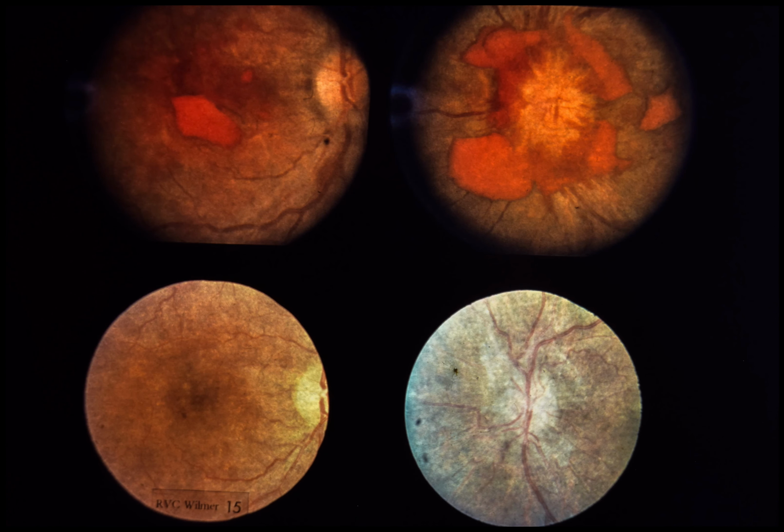Slide 15. Papilledema and subarachnoid hemorrhage. This 52-year-old female had the sudden onset of severe headache and stiff neck. At the time of initial examination, she was semi-comatose with poorly reactive pupils. Upper left. The right macula contains numerous intraretinal hemorrhages and a large subhyaloid hemorrhage. Upper right. The left optic disc is markedly edematous and is surrounded by subhyaloid hemorrhages.